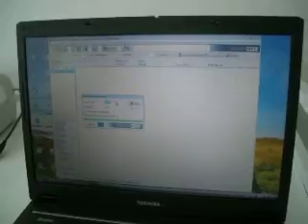This is how you start a measurement, and this is how you start a repeated measurement. So if you are working on a protocol, on a study, then you can set up the device to measure automatically several times in a row. For example, I can set up a test 30 minutes long with a frequency of 10 minutes.